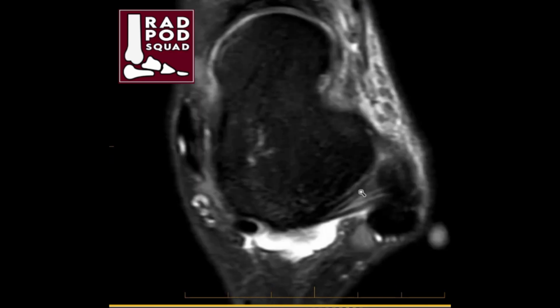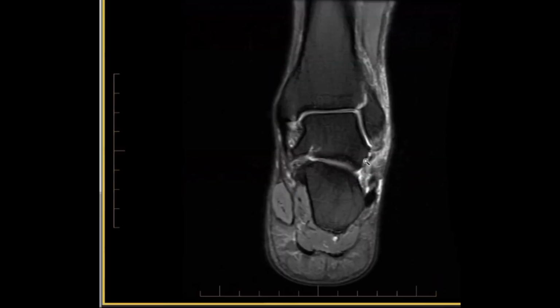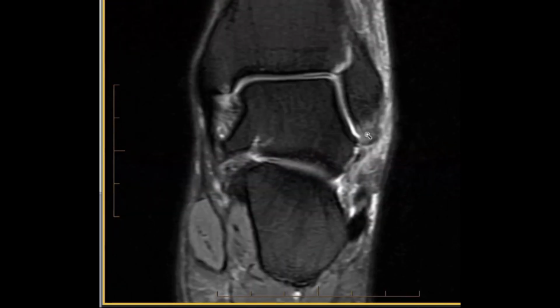And then we can look at those fibers of the PTFL, and the calcaneofibular ligament here. Part of it is here, there's periligamentous edema, and there's sprain and irregularity as it attaches to the inner aspect of the distal fibula. We can also see on the coronal imaging the region of the ATFL and the sprain that's occurring more on the fibular side and the actual edema at the lower tip.